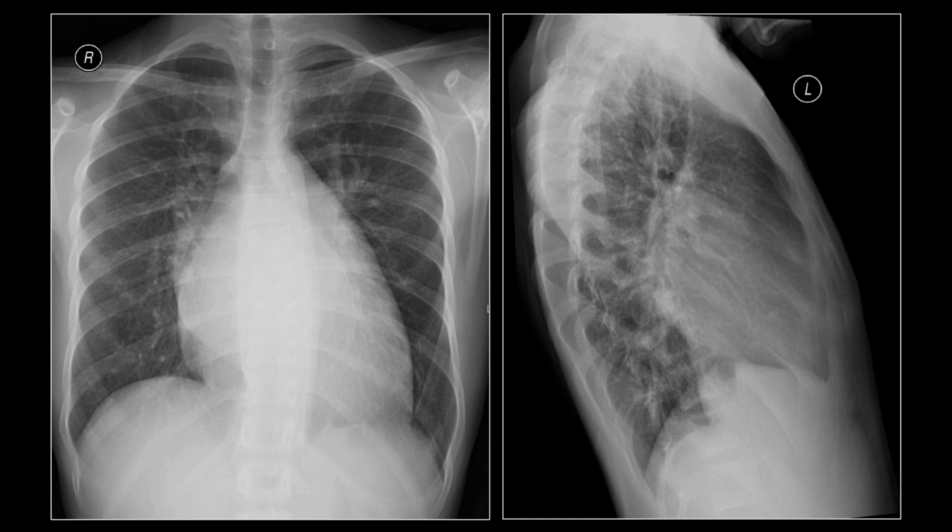Once you finish that part in the examination, the discussion would go to the differential diagnoses and recommendations. And never forget to mention recommendations in any oral examination. So let's start with the differential diagnosis. It's not that difficult. You need to have a few reasons for dilatation of the left atrium. The common things to think about would be mitral valve disease, whether stenosis or regurgitation. Would be heart failure, left-sided heart failure in particular, with back pressure leading to dilatation of the left atrium, and this is very common in practice.